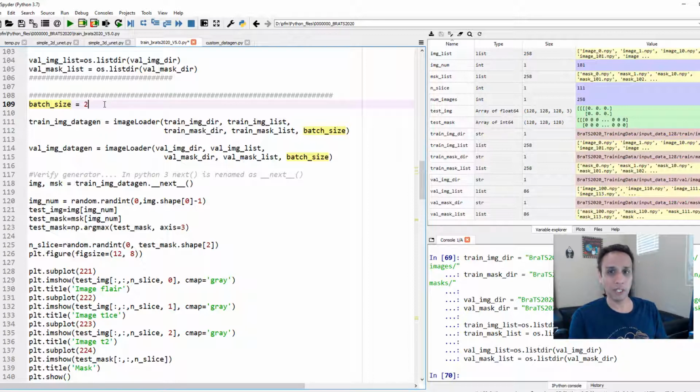The other thing I could have done is, instead of 128, I could have chopped these into 64, 64, 64 volumes, and then worked with higher batch size, but I don't see much of a difference. And in fact, I prefer not to do that, because you would lose context with the rest of the regions, right? It's nice to have the context provided within the field that you're defining here. I hope that makes sense.